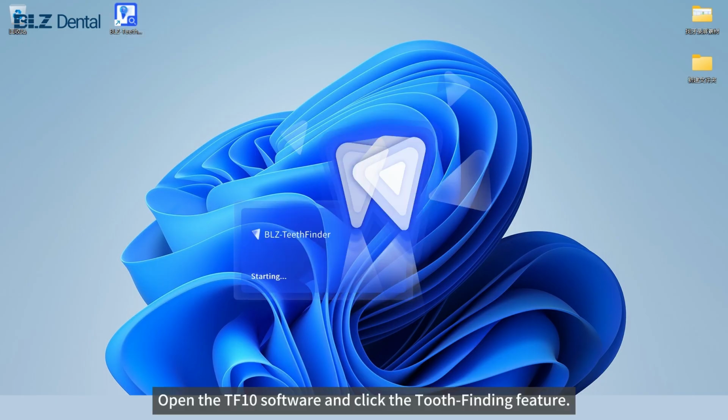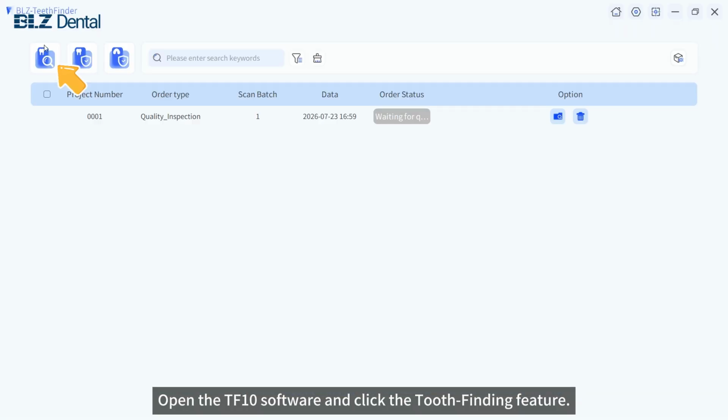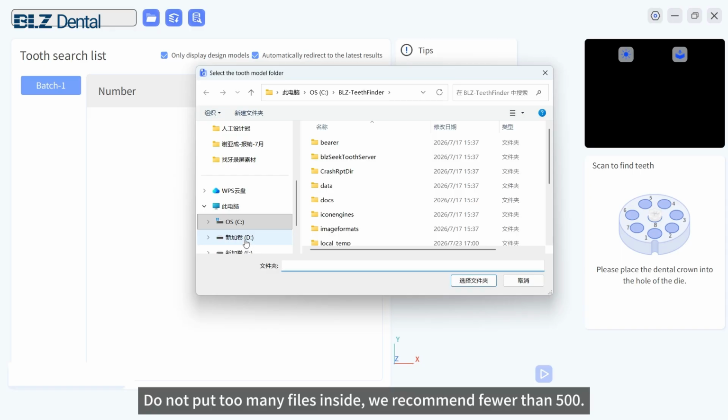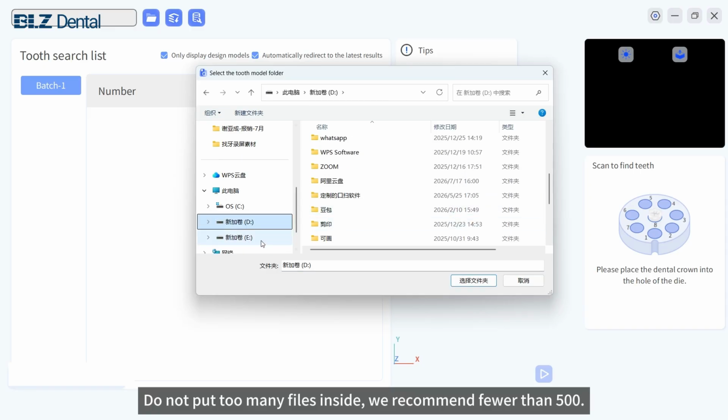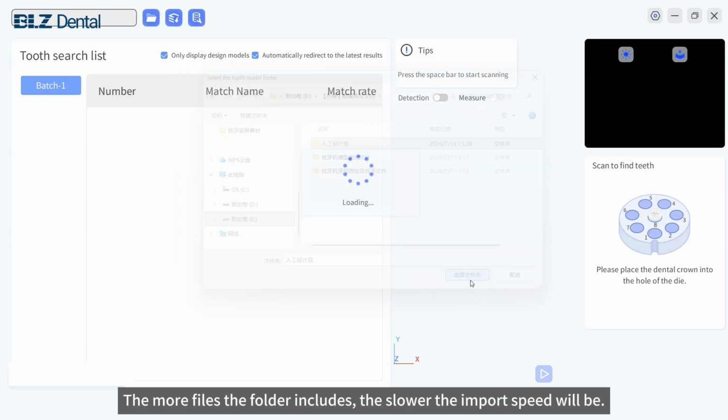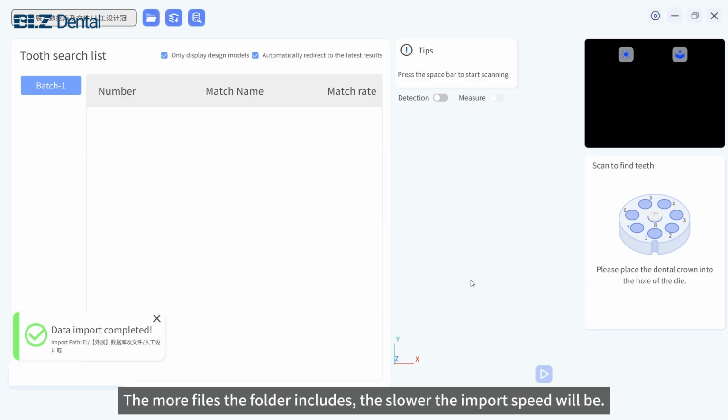Open the TF10 software and click the tooth finding feature. Import the folder with target design files. Do not put too many files inside. We recommend fewer than 500. The more files the folder includes, the slower the import speed will be.